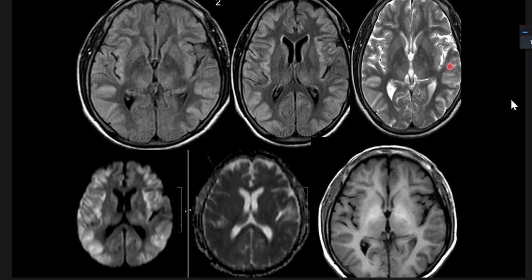Cortical thickening. Okay, right-sided? Do you see only the right side? Both sides, sir. The cortex is thickened, showing diffusion restriction. So you are seeing something diffuse, which is symmetrical. First important thing, is it bulky? Is it symmetrical? Is it hyperintense with restricted diffusion? 5 things you have to tell.